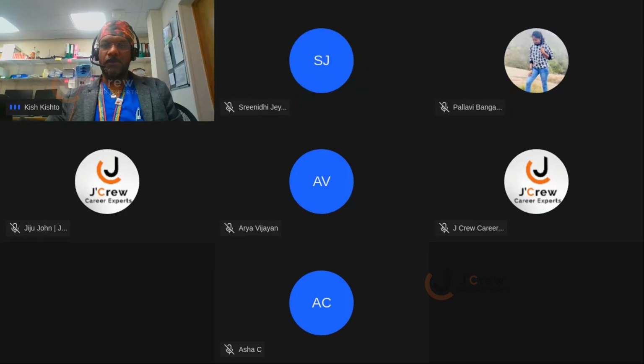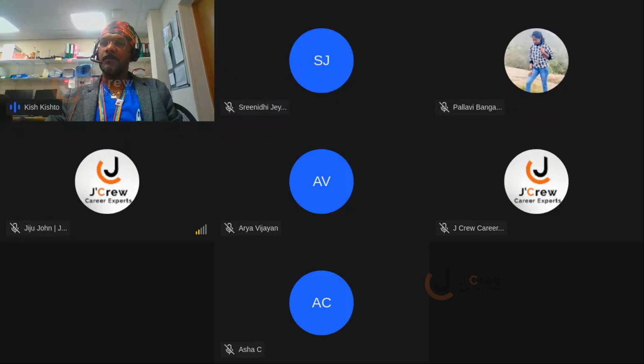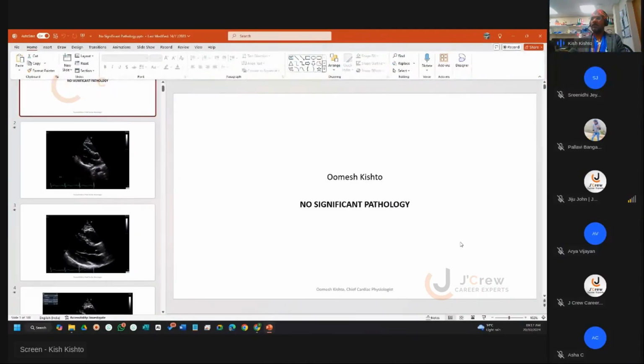What we're going to do is just review the normal minimum data set from yesterday, and then I will show you what the guideline states for the normal ranges here. After that, we will look at some pathologies. So everyone's seeing the image at the moment?